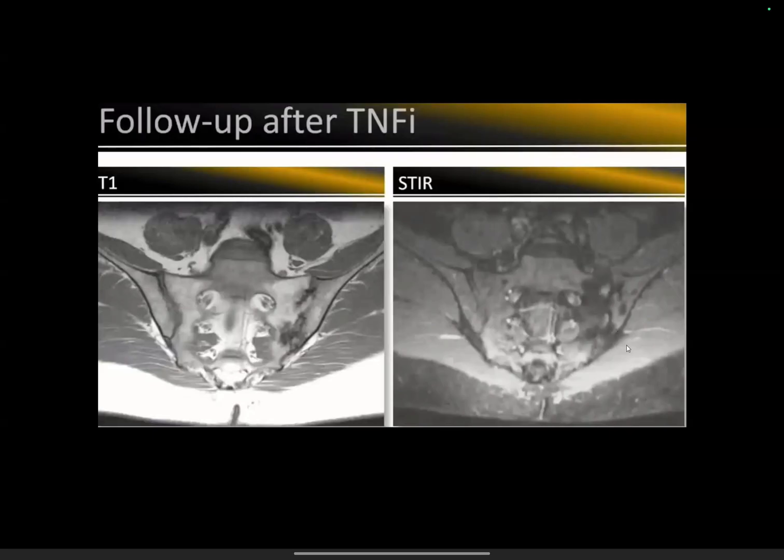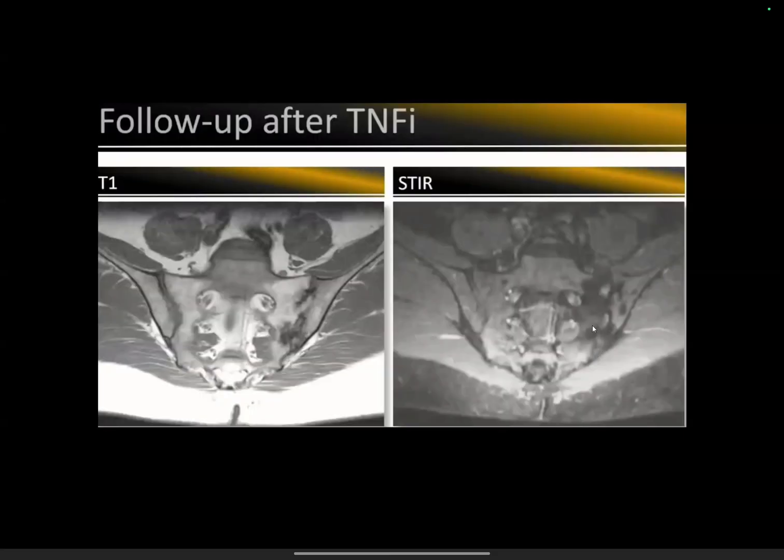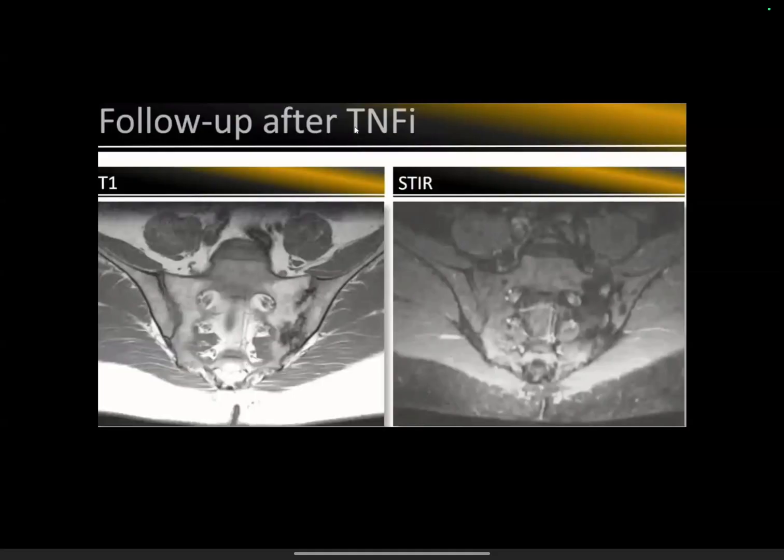And it actually extended along. Initially it was only on the sacral aspect, but later it extended along the iliac aspect also. So this patient had this initial picture, was diagnosed as ankylosing spondylitis, and then was treated with TNF-I, and still there was some disease progression. This is a more chronic form of the disease. What is happening? Actually, this patient got misdiagnosed.